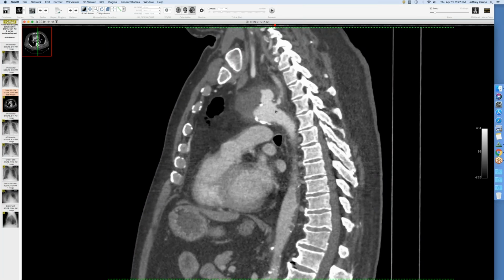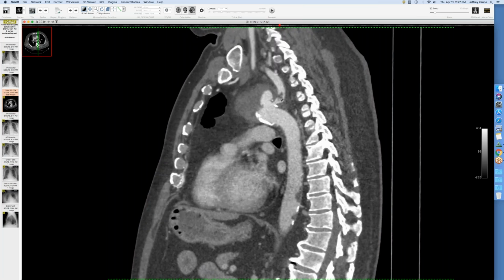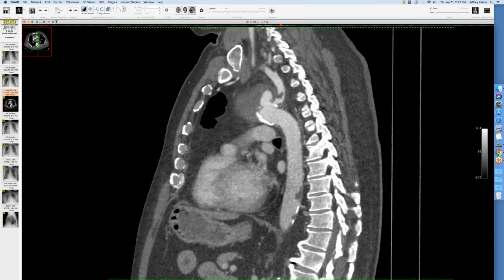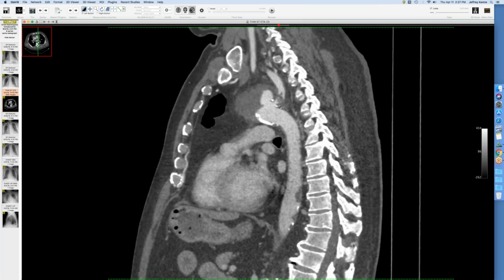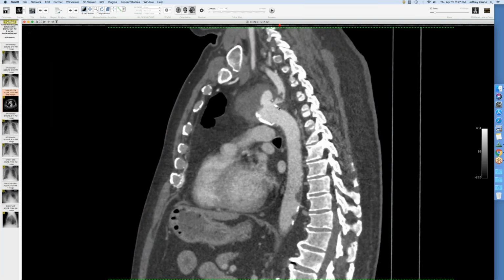But when you scroll through that proximal left subclavian artery, there's something. Yeah, there's a filling defect in there, a little thrombus probably, and then there's narrowing of the neck, the origin. Gosh, that's so interesting. And the patient wasn't clearly septic, maybe not with bacteria at the time, not really, not that I know of.